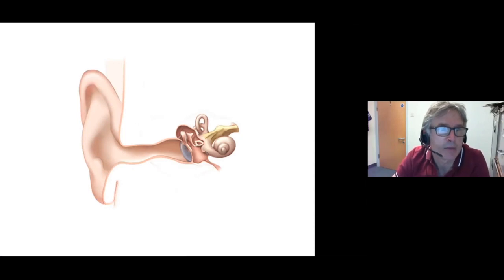The reason that we can image it beautifully is that we have high resolution CT with reconstructions that can go down to less than 1 millimeter. And in fact, with new cone beam CT, we can take it a stage further as well. The reason CT is so useful is that we have dense bone within the petrous temporal bone, and then air within certain structures, so the mastoid air cells, the middle ear cleft, and so forth. And this allows us to see the very, very fine, detailed bony anatomy.